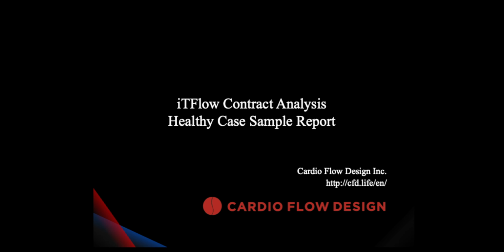Hello, today I'm going to guide you through a comprehensive cardiovascular analysis using the iTFlow software, which leverages 4D Flow MRI technology to visualize and quantify blood flow within the heart. We'll examine both the left and right ventricular systems. The data presented here belongs to a healthy volunteer and can serve as a reference index for each measurement.